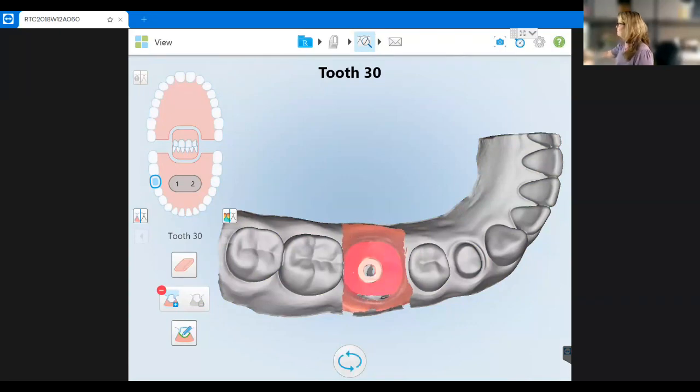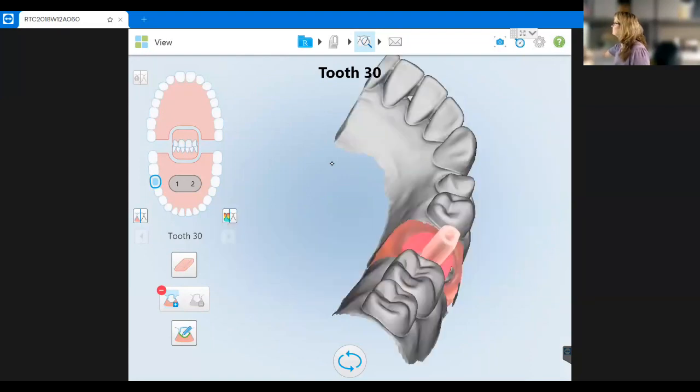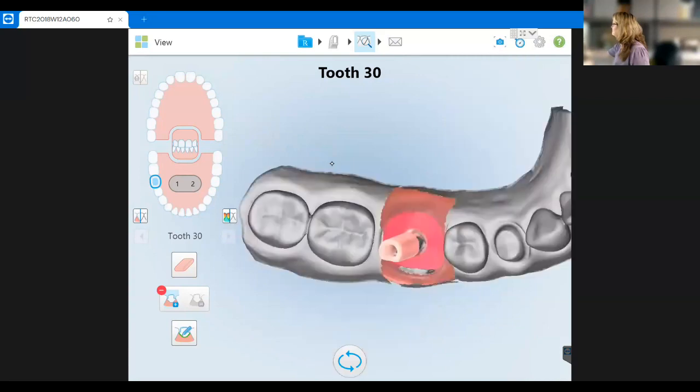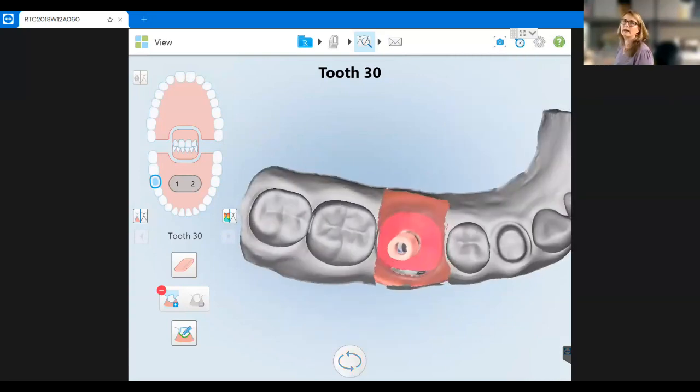And when you tap on the swirly arrow at the bottom, when it turns blue, you're able to move it around, right? And when you tap on it and it's gray, then it stays still again.